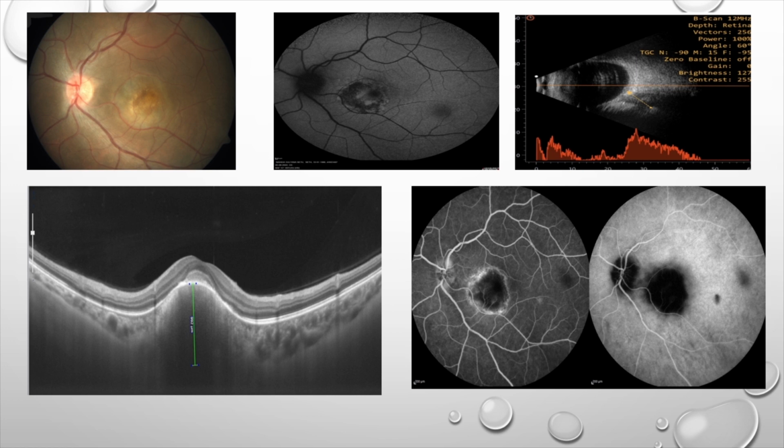See, the main reason you're not able to get this is because it is a pigmented lesion and there is shadowing behind. And that's the first reason why it cannot be a choroidal hemangioma. This is a solid lesion with shadowing. That is why you can't get the lower limit properly. So if you're showing it this way, you cannot estimate tumors like this because you never know if it has involved the sclera or not.